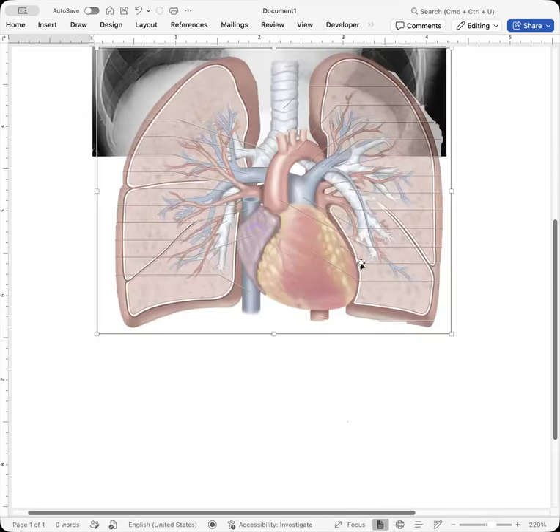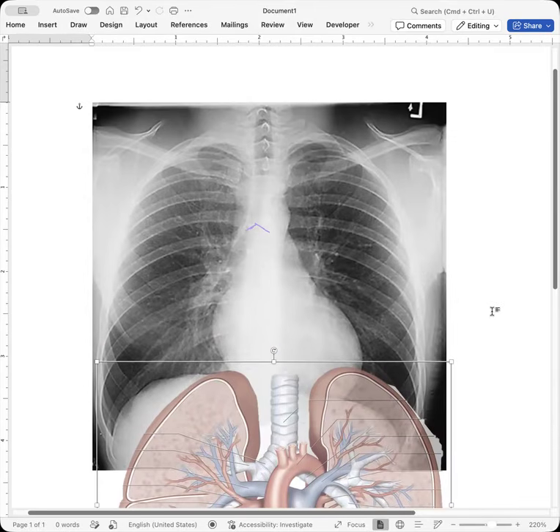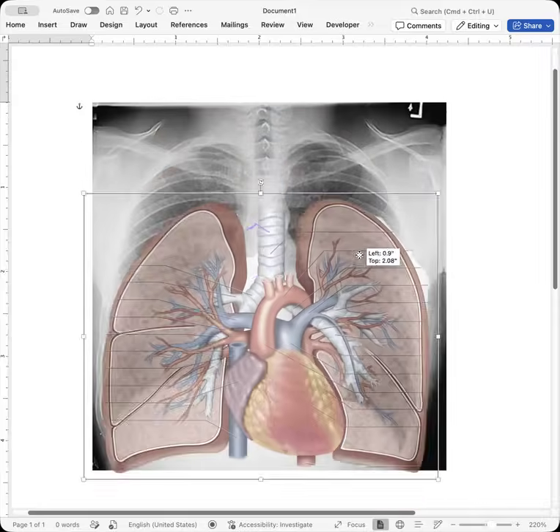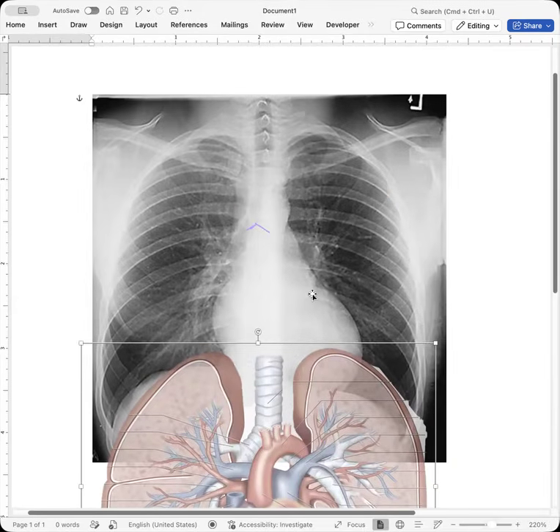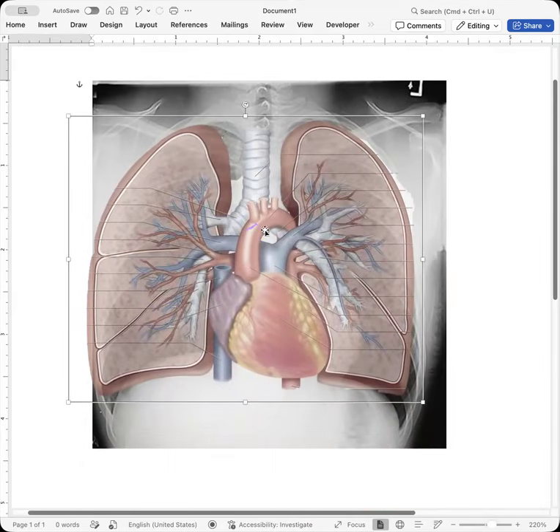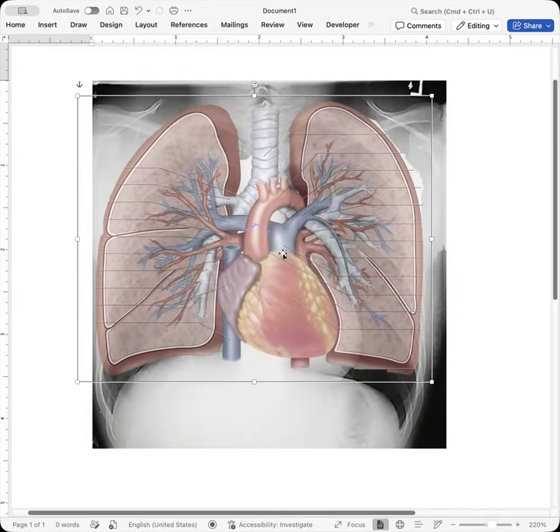So if we follow the respiratory system, not seen here are the pharynx, so the naso, oro, and laryngeal pharynx. And then we get down into the trachea, which is seen here in this darker spot. If I overlaid it here, you would see it's held up by 16 to 20 rings of cartilage. Now, once the trachea goes down and it bifurcates into the right and left mainstem bronchus, that's going to happen at the carina. I've already drawn my little purple lines here for the carina, but that's where it bifurcates. On this image, it's a little bit covered up by the aortic arch, but it's there.